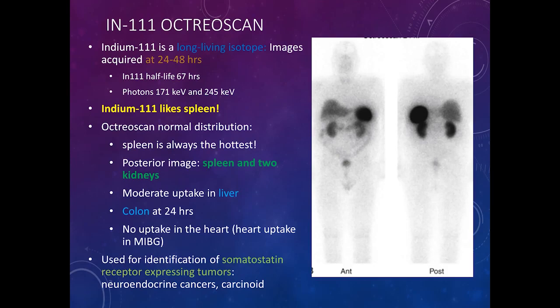Usually my technologist calls me at the 48-hour image and asks me if I want to bring the patient back for a 72-hour image. So indium-111 half-life is 67 hours. It emits photons with energy 171 keV and 245 keV, which is quite good for imaging. We get nice and sharp images.